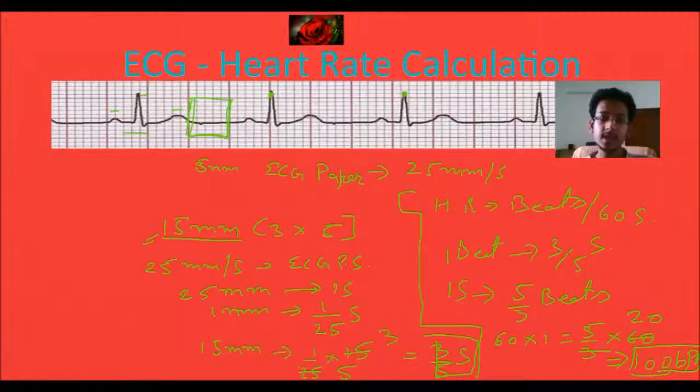A better perspective to derive the heart rate exactly. Now we can also put here 19 mm or 20 mm and we get the exact beats per minute. I hope you are smarter than before now by watching this video.